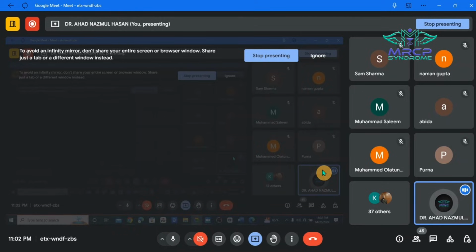So the density of the tissue or density of the organ is directly proportional to the attenuation of the X-ray. Tissues like air or water have very little attenuation, so they will be displayed as low densities, meaning they will appear as dark. But in case of bone, they usually have a higher attenuation, so they will display as a higher density or bright in case of CT scan.